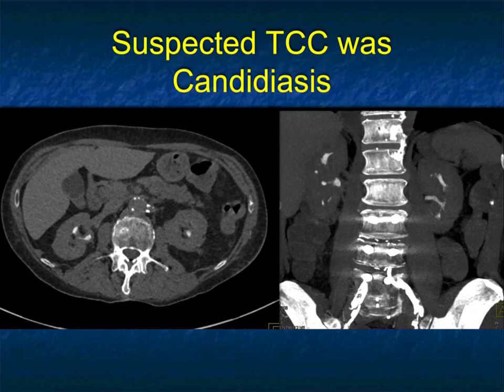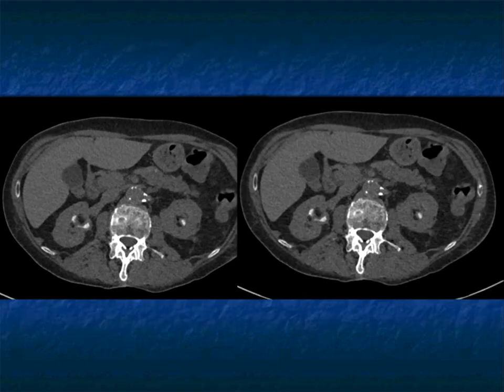Now, sometimes you're going to lose. This patient had distortion of the calyces bilaterally, particularly the left kidney, but it's bilateral. And I guess theoretically you can have bilateral TCCs. It does occur, but there's something infiltrating around the calyces. Could it be lymphoma? I don't see the mass effect. It's not a renal cell. TCC is a good thought.